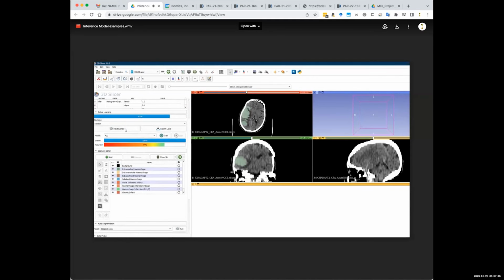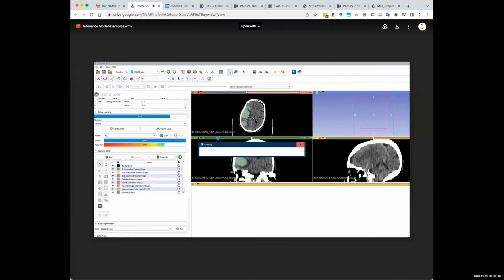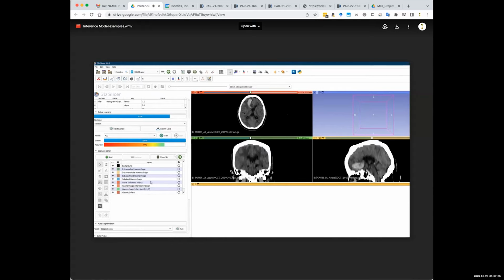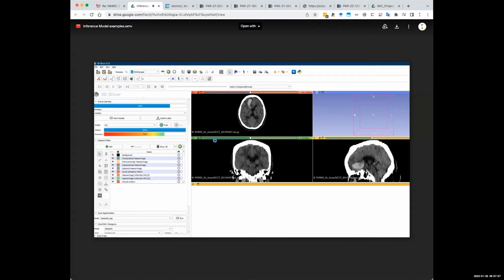So I have to say I'm pleased with the progress to date. I'm optimistic that we will be able to optimize the model in the near future. And I'll just show you one last one if you're not convinced this works well. And that's excellent. If my student brought me that, I would have a hard time being overly critical. I probably would, just because I am, but I wouldn't be displeased at all.